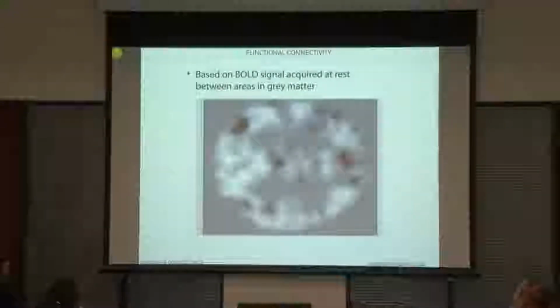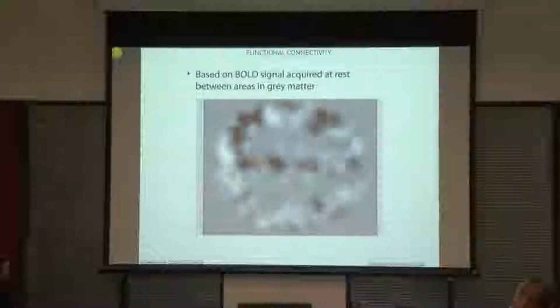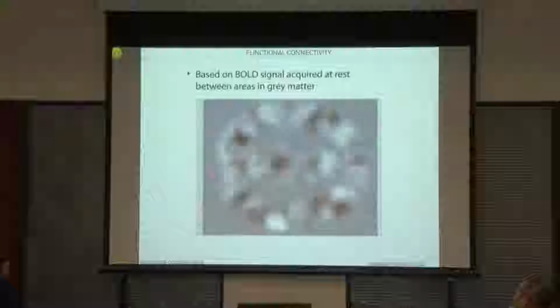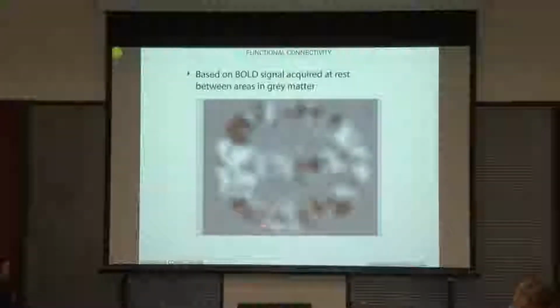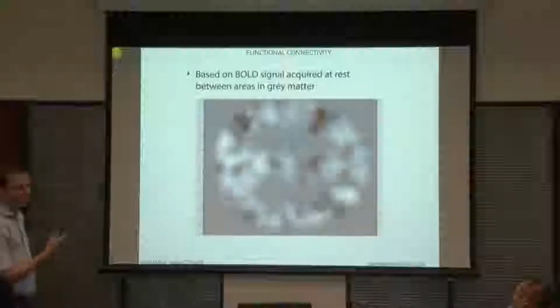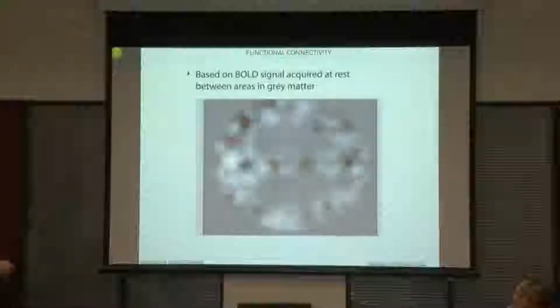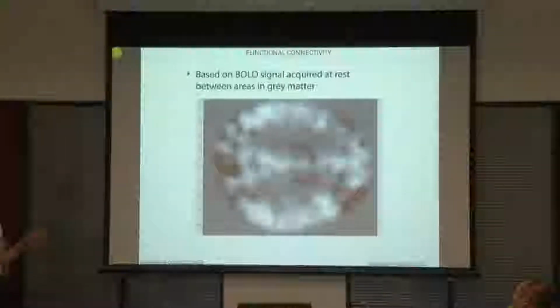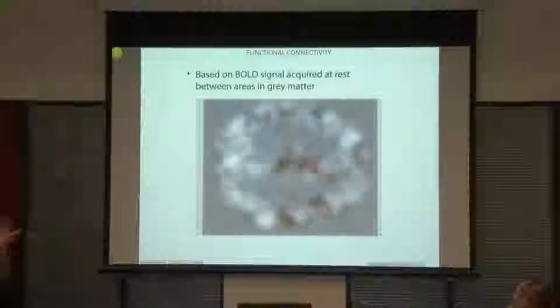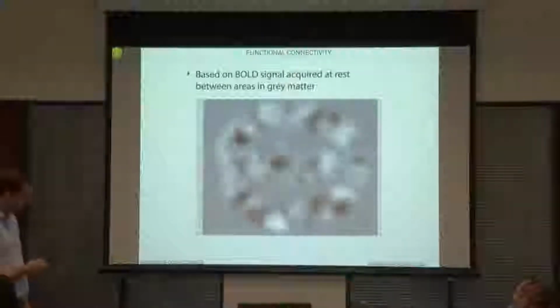So this is just a video which shows the BOLD fluctuations, so the centrality fluctuations in the sliding window analysis. So you see that this changes over time. It's a bit like Sebastian Sohn mentioned, that this may really change based on the state of your brain, whereas the diffusion MRI connectome is slower and usually only changes over years or months, if at all.